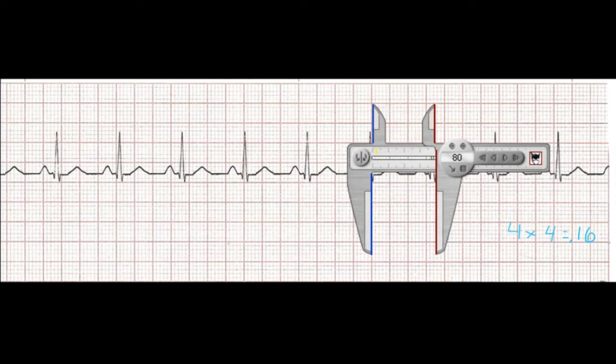Here's a couple different things, right? So if I'm remembering this, I have a QRS complex that is right here. Okay, this is my first one. And then here is where my QRS complex goes after that, right? This is where it ends. So I want to know the number of blocks between here, okay? So I need to know what the number of blocks between here is. So when I look at this, I realize that here's 5, 10, 15, 16, 17, 18.